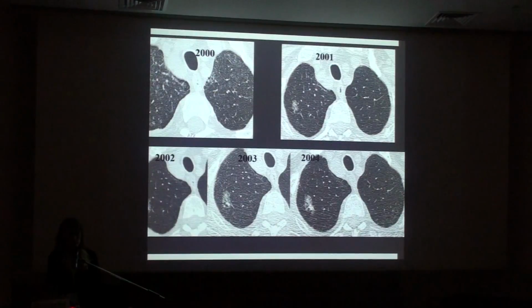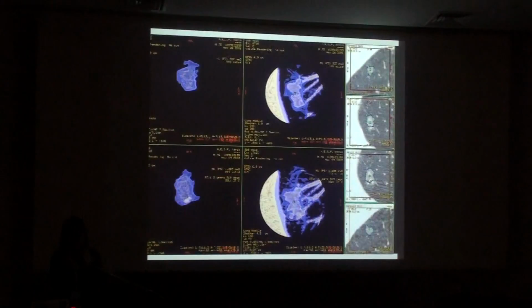And as I mentioned, it's very important to compare not 2004 with 2003, because there are very little differences, but you need to compare the 2004 CT examination with the first CT examination, and it's obvious that the nodule has increased in size and that a solid component develops. The very frequent mistake is to just use the previous CT and to say, okay, nothing has changed. No, we need to get the first CT evaluation that we can have.